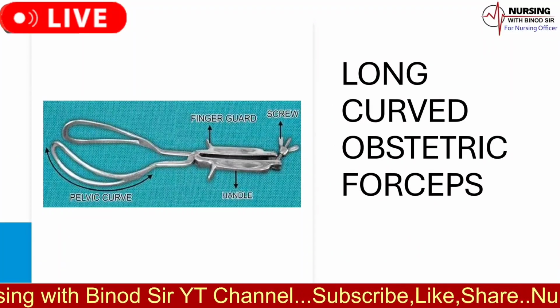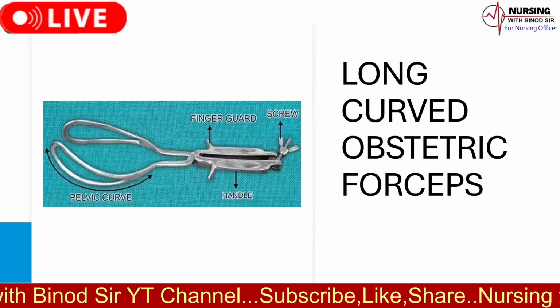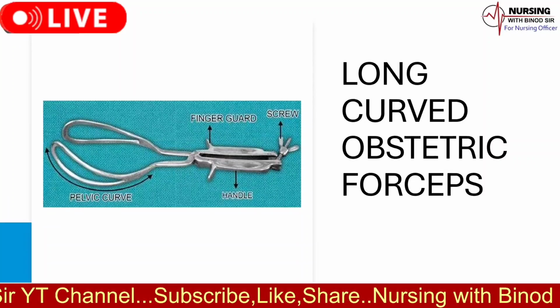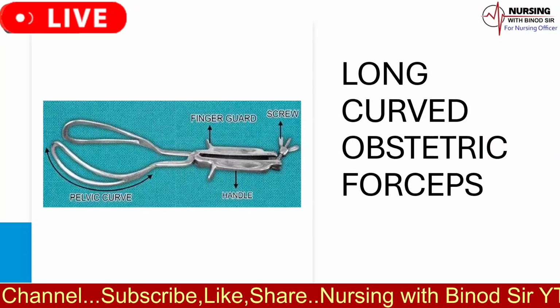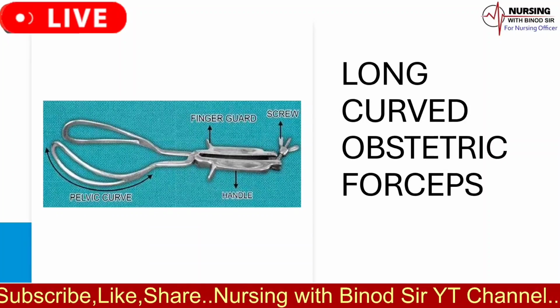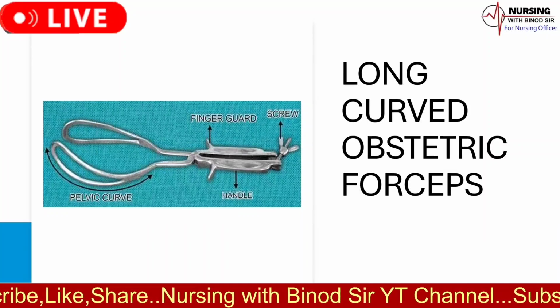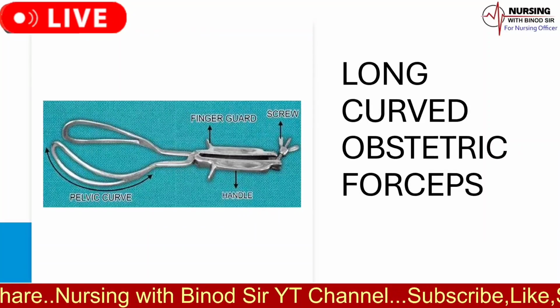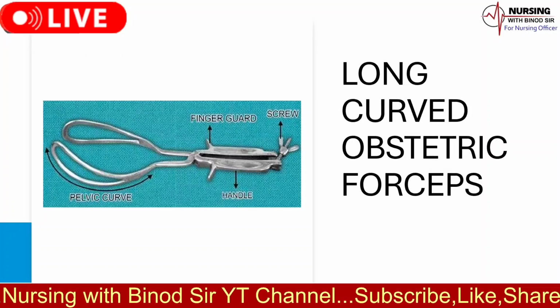The name of the instrument is long curved obstetric forceps. The uses of long curved obstetric forceps is as follows. 1. Assisted vaginal deliveries. Long curved obstetric forceps are used to assist in vaginal deliveries, especially when the baby's head needs gentle guidance through the birth canal.